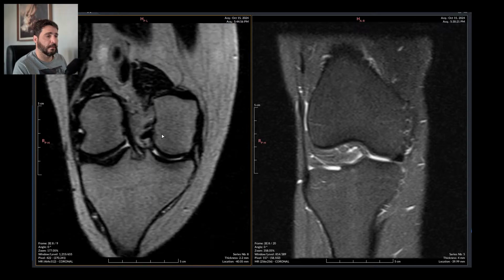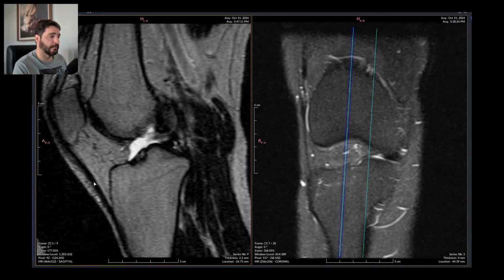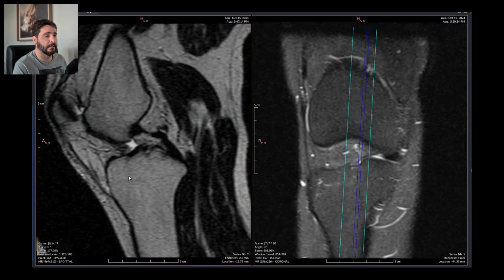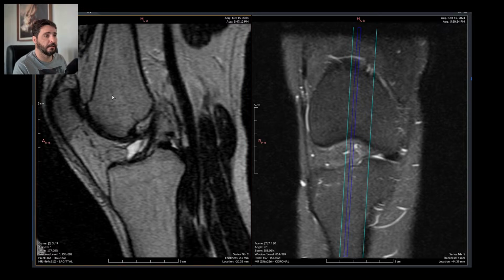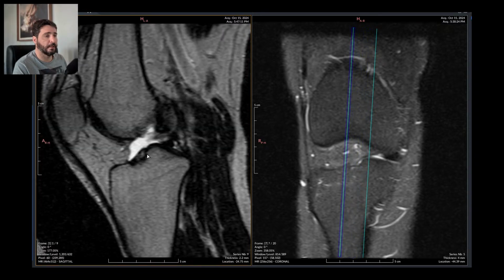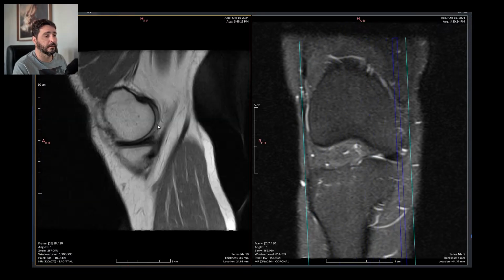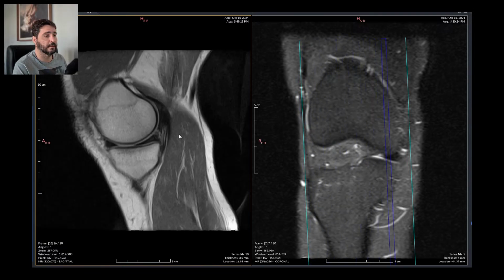He did an unsaturated oblique for the anterior cruciate, which means nothing to us, and he also did a useless oblique sagittal acquisition filled up with noise and kinda shaky, which doesn't help us a bit, but it is here, so it's better than not having it, I suppose.